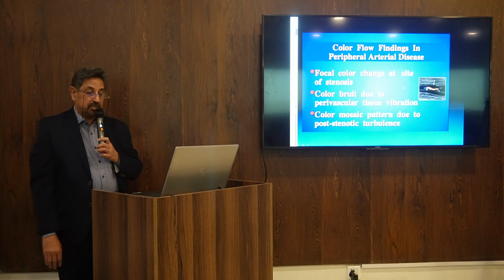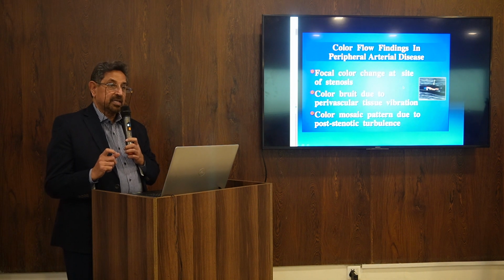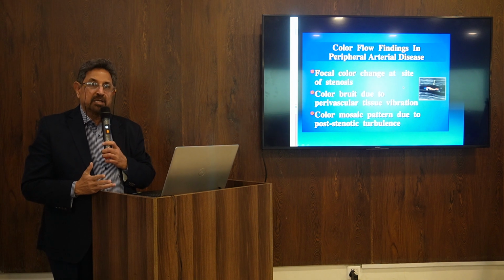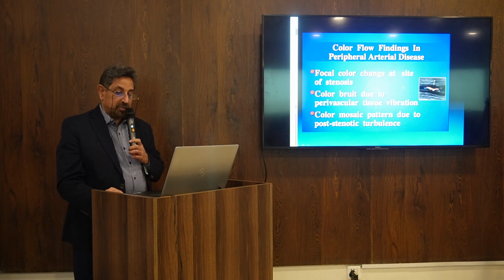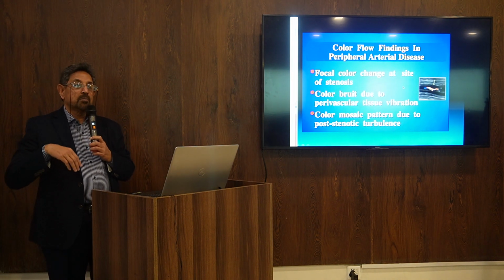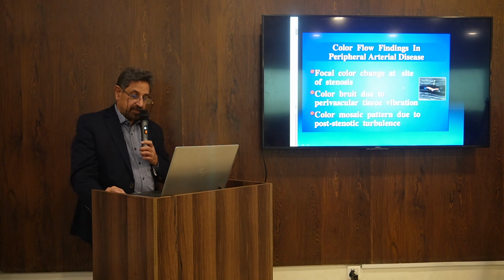When, due to the disease in the vessel, stenosis, the velocities many times increase. While you squeeze any pipe, will the velocity be slow or fast? It will be very fast. Rocketing of velocities there, and very, very high velocities appear like this. This is called aliasing. On spectral Doppler, it will go beyond our limits. We will come to that point, how to get rid of that aliasing.